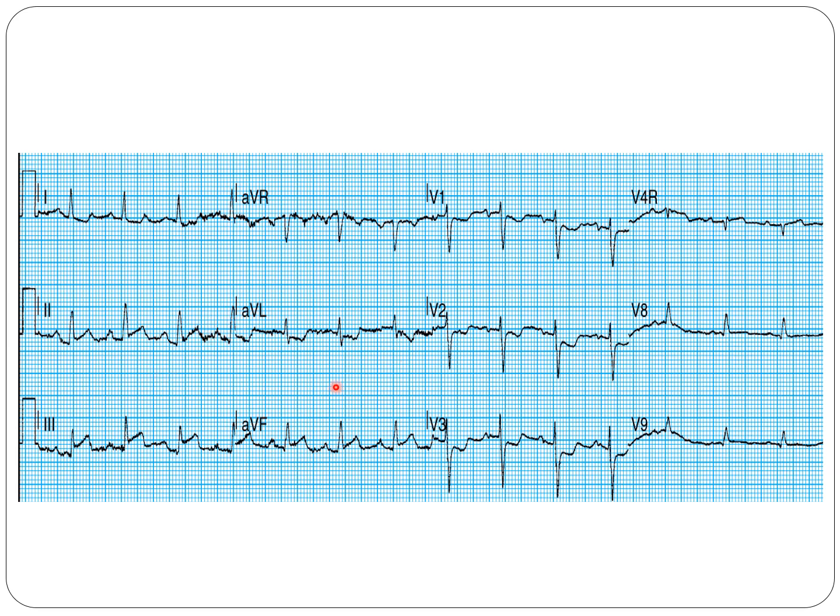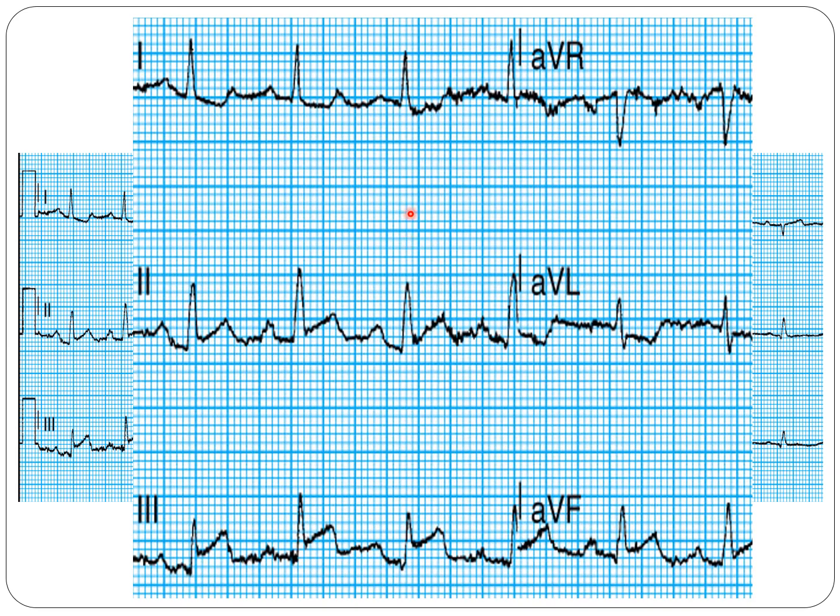again, this looks rhythmic. The heart rate is around 1, 2, 3, a little bit less than 100, around 90. We do have P waves. This is the noise over the P's, so it's not an atrial fibrillation, it's only noise. The P wave is normal, PR interval is normal, the width of the QRS is normal, the axis is normal. The axis is about 60 degrees because AVL is equiphasic.